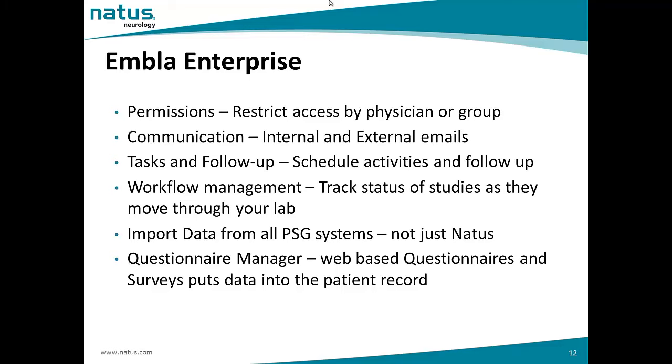Another unique thing about Enterprise is we can import data from all PSG systems, not just systems from Natus. Let's say, for example, a sleep lab has 10 different kinds of PSG systems. The doctor is moving on to buy new systems from Natus, but at the same time they would like to keep all the data or reports they have been using from the 10 systems earlier on.